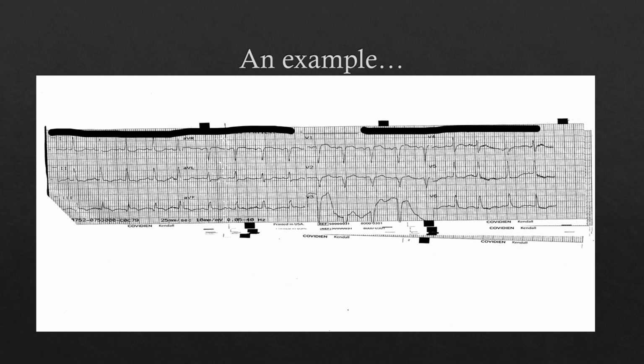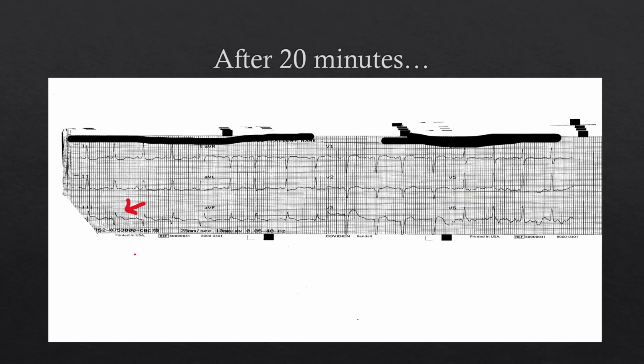So this patient was transported to a PCI capable facility, and serial ECGs were done. If you look, I want you to focus really hard on lead 3. You advance this, and you see in lead 3 now that Q wave has deepened dramatically over the course of 20 minutes. That's the acute change that can cinch the diagnosis that we're dealing with that occlusion MI. Patient had 100% RCA occlusion. They never developed our ST elevation in the course of the first hour of care.